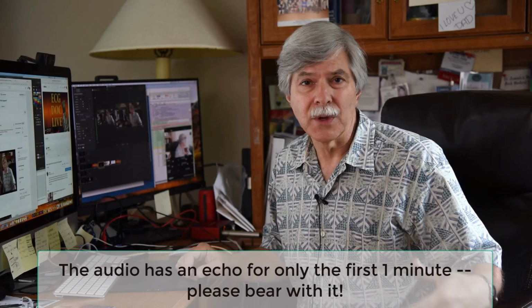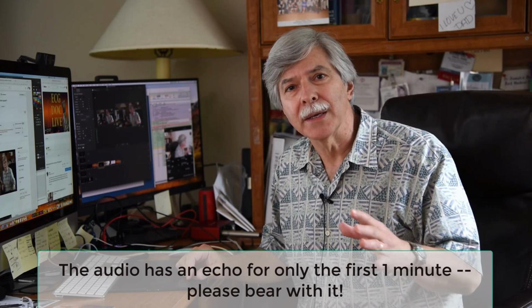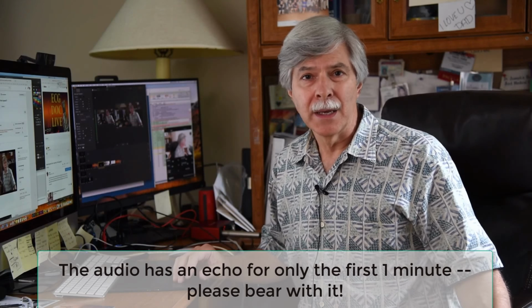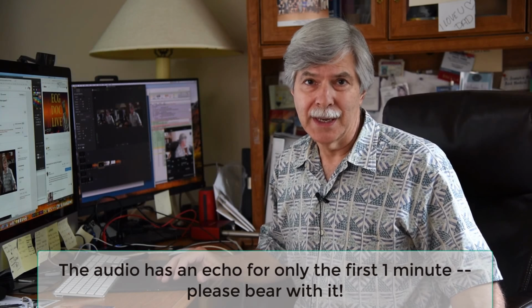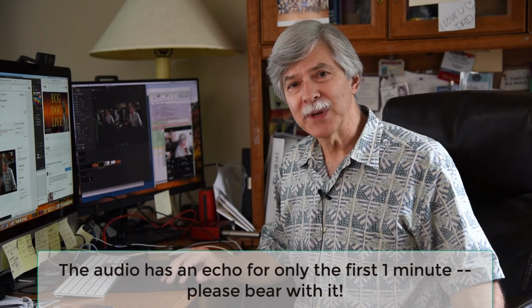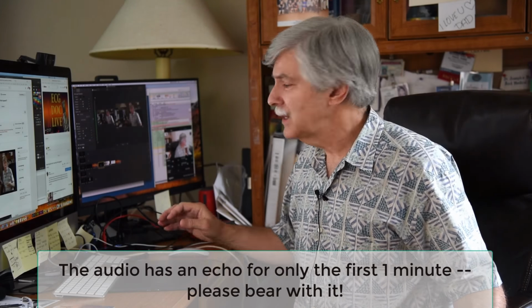But I wanted to share my clinical experience with you and bring the ECG information into more of a clinical realm. So talk about case presentations and treatment of arrhythmias that hopefully will give you a better idea of what to do with your patients. So this is a case presentation, and we'll get right to it.